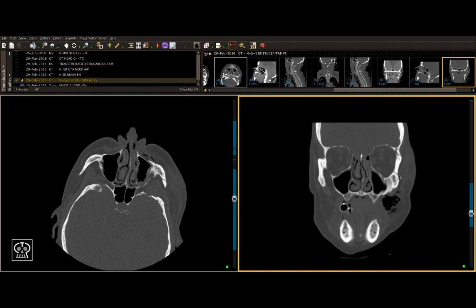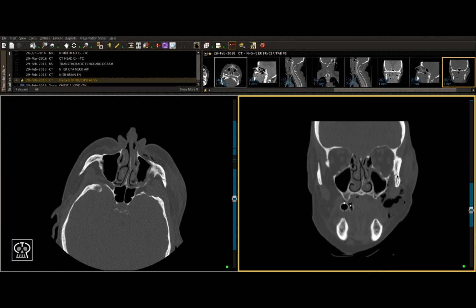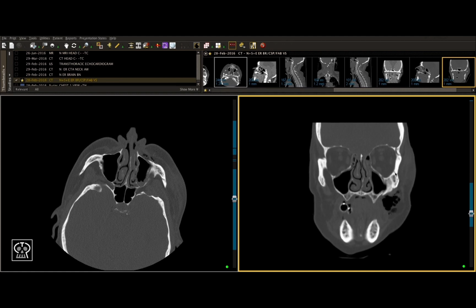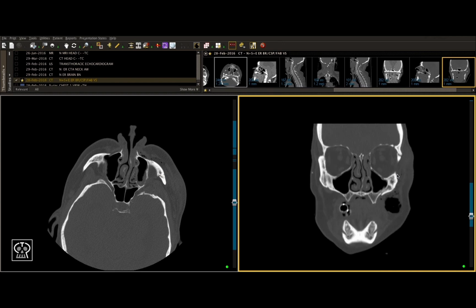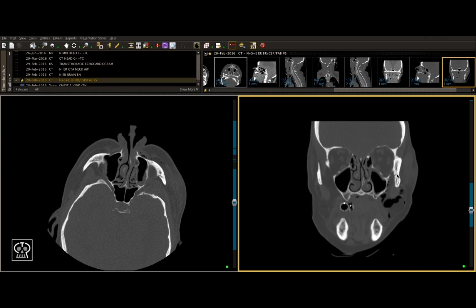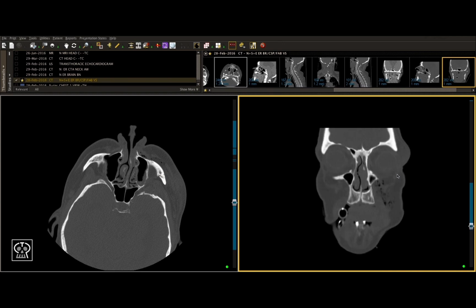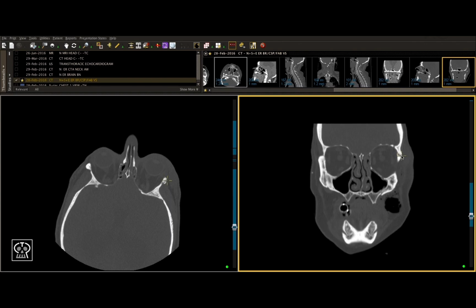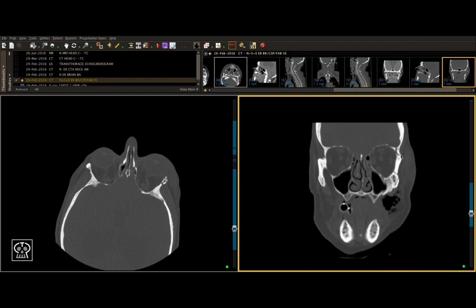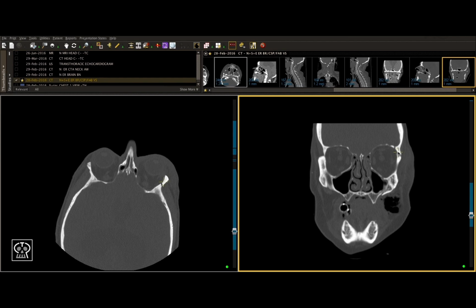The arch fracture seems to extend all the way through the zygoma itself to the lateral orbital wall, as seen here. In addition, we have a fracture at our ZF suture area, involving not only the lateral orbital wall, but the superior orbital roof as well.